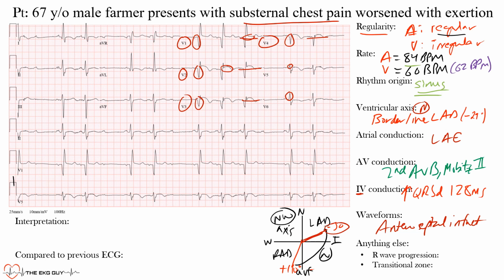All right, another pattern I want you to notice here, I told you there's a lot going on here, is a right bundle branch block. Well, you may say, I don't see that rabbit ears pattern. Well, you have to know that even in the setting of an infarct, you can still have a right bundle branch block pattern. It does not obscure it. Whereas in left bundle branch blocks, we start thinking of using Sgarbossa criteria or some other ways to identify it, because the left ventricle makes up most of the QRS complex.